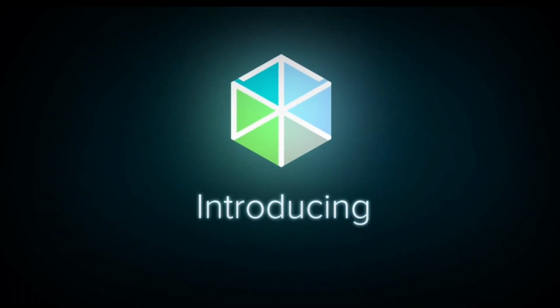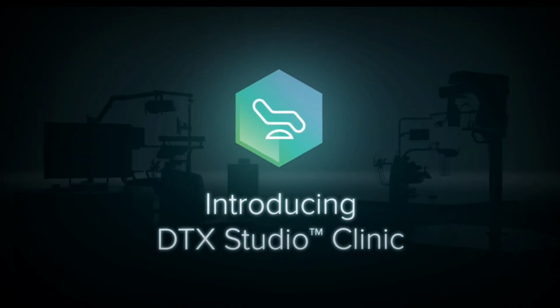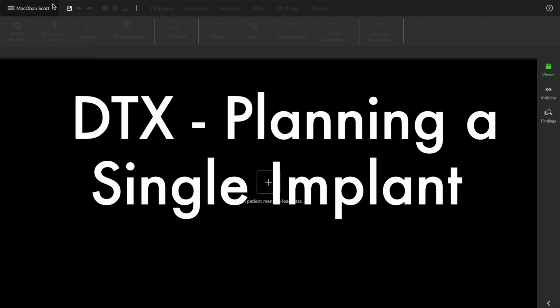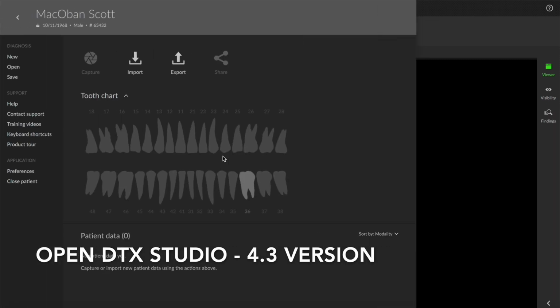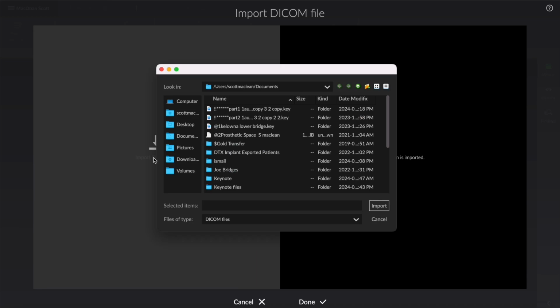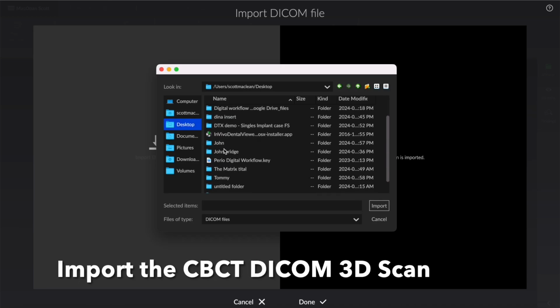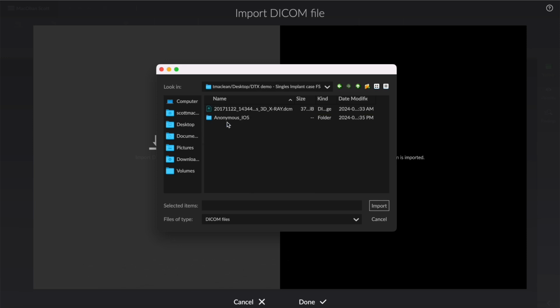This is a YouTube video about planning a dental implant using DTX Studio Clinic, which is a wonderful software that you can take and plan and store files and do different really cool stuff. So we'll be showing you one of the simplest things it does, which is to plan an implant using some AI functions. You'll use the DTX Studio Clinic software to actually bring the files in from the scanners.